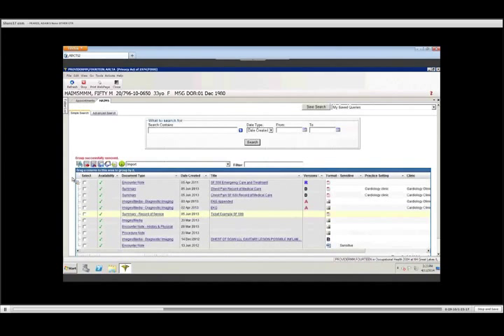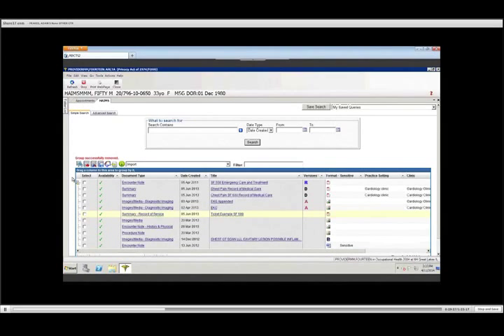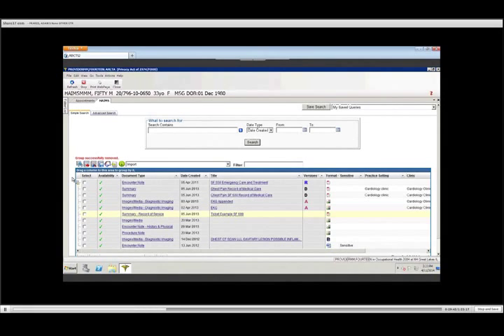Another thing to keep in mind, whoever has the clinical role for HAIMS, any person can group and any person can ungroup. And the grouping does follow the patient. It does not follow the user. So if user Joe groups 4 assets together, user Sally can log in and look at the same patient, and she will get the benefit of seeing Joe's group. However, Sally does have the ability to delete Joe's group if she chooses to.